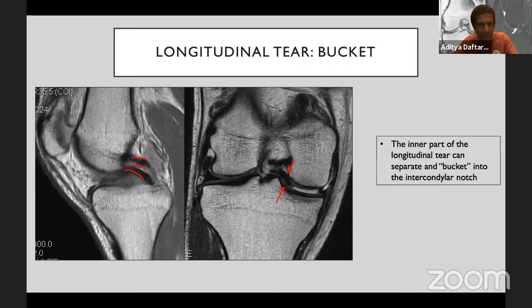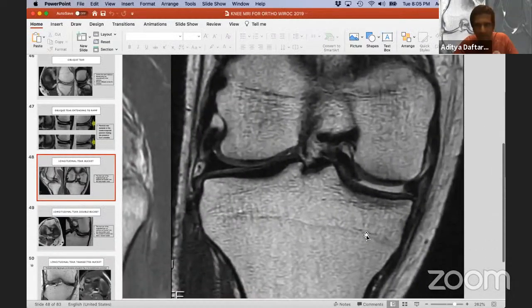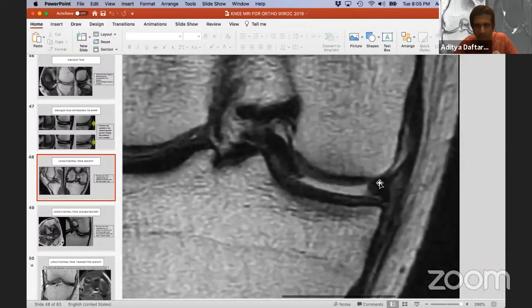Other things you can look for sometimes are the margins of these. Let me see if I can do one thing here. I'm zooming in to show you. You can look at this margin over here. Yeah, rounded. Sometimes it looks more rounded, but it's not great. I wouldn't bet anything on it. But from your standpoint, it helps. You could tell the patient, look, it looks a bit rounded, we'll try and see if we can fix it, but we're not 100% sure we will be able to because it looks like it may be older. As opposed to saying, it looks less rounded, it looks more acute, I'm pretty hopeful we should be able to fix this. And ultimately, the decision you'd have to make on the table, unfortunately.